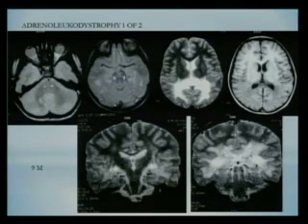Adrenoleukodystrophy is one of the many confusing abnormalities that are broadly categorized under toxic metabolic diseases, demyelination or dysmyelination. And they are extremely complex, for me at least. But I chose this because it is one of the few of those entities that, for some reason, affects primarily the posterior portion of the brain, initially. Okay. In the advanced stages, these diseases look like each other.